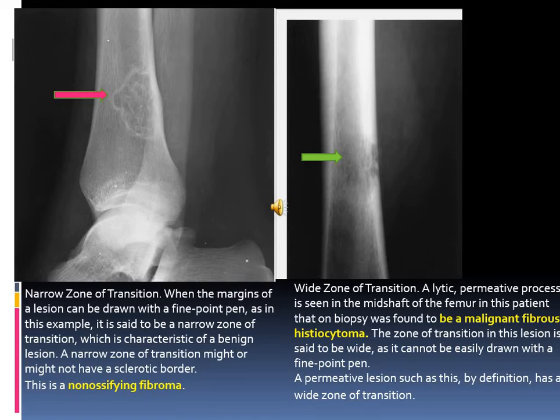So it means that this is an aggressive lesion or wide zone of transition.